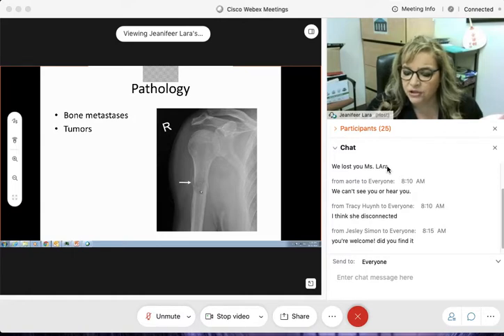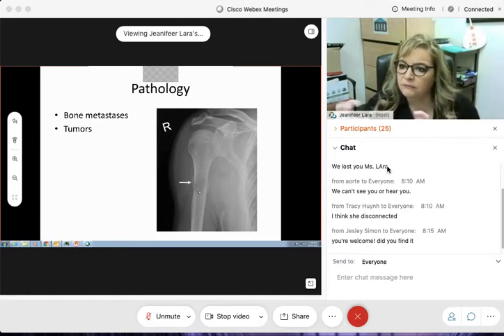Because of this change here, it looks like there is some type of erosion, and eating away. And remember, tumors survive by depriving the tissues around the tumor of nutrients. Make sense? Yes? Thumbs up?